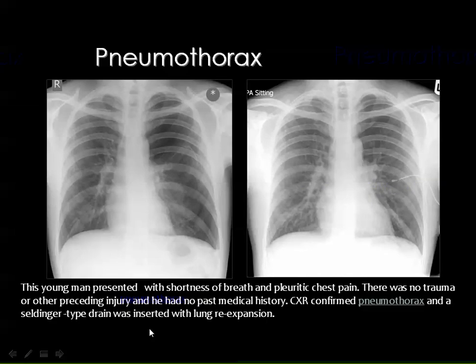And of course, minor amounts of pneumothorax are one of the tricks in the exams everywhere. And the clue for the presence of pneumothorax is to identify the pleural surface here. And if you look to the rest of the hemithorax, you cannot see any vascular markings in this area because there is air only here, and this is the pneumothorax and this is the pleural line.